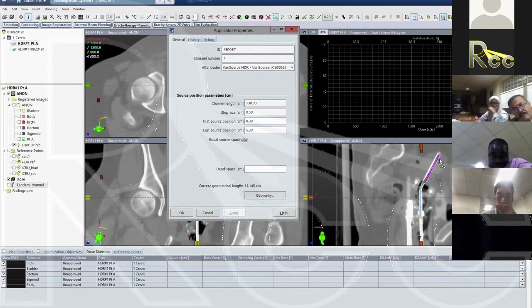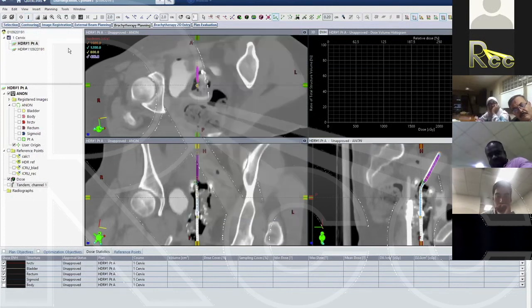As Derek mentioned before, we don't want to load past our flange or our ring or ovoids, to avoid protruding sources, or flaming sources, as some call them. Here we have about a 5 centimeter active length, and then we would do the same for the ring.